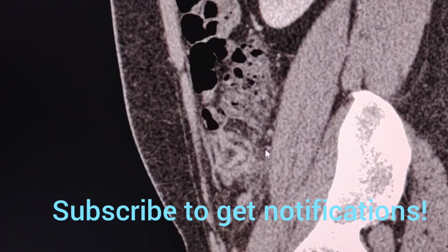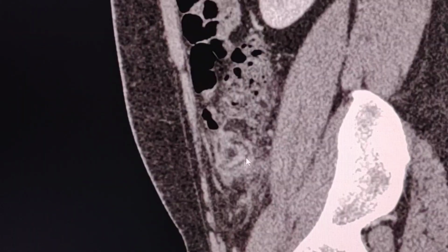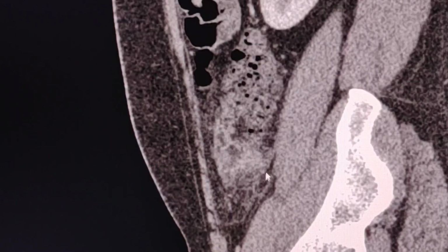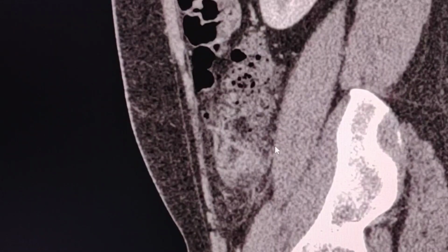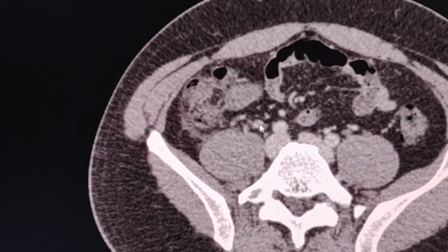Here we can see in sagittal view the right colon, the cecum, and there is fat stranding in this area around the cecal pole, and the fat stranding extends between the cecum and the right psoas muscle. A few lymph nodes like these are mildly prominent.